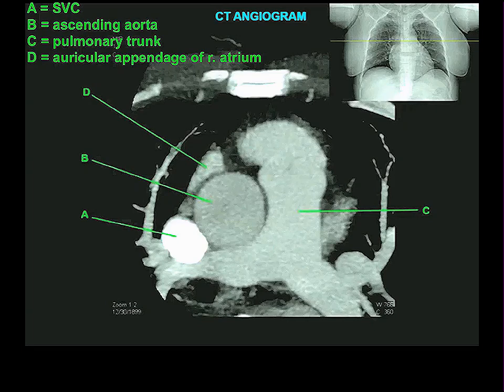So this is a familiar picture. This is pulmonary trunk, to the right of which is the ascending aorta, to the right of which is the superior vena cava. These little bulges here, those are the sinuses of the pulmonary valve. That means the pulmonary valve must be right here. That means this must be right ventricle. Right pulmonary artery, left pulmonary artery.